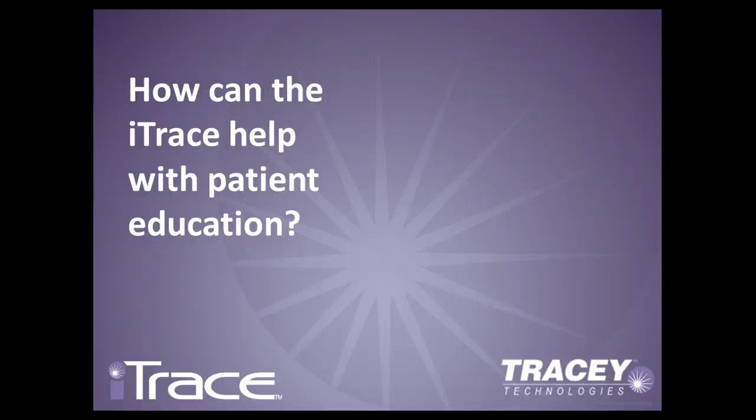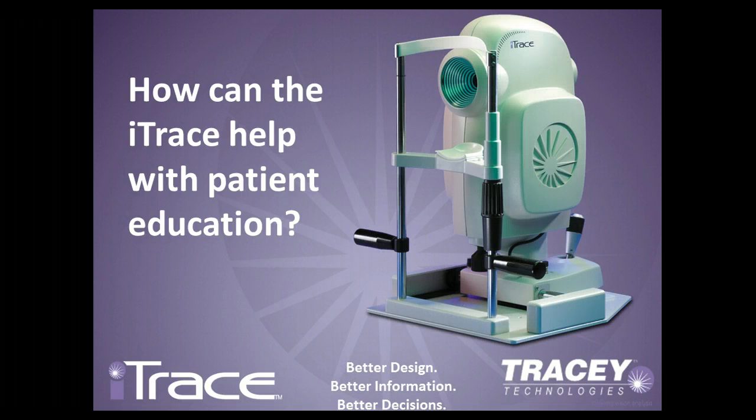Welcome to this edition of the Tracey Technologies webcasts featuring the iTrace Wavefront Aberrometer and Topographer. Today we'll review one of the powerful software displays available with the iTrace and look at a patient case that demonstrates the value of the software.